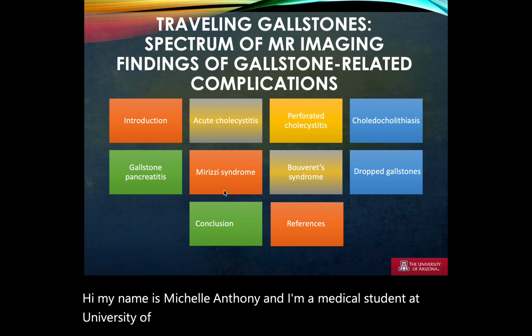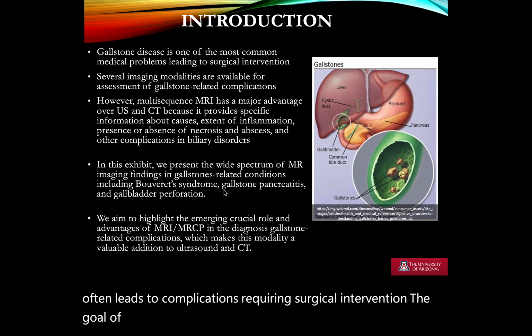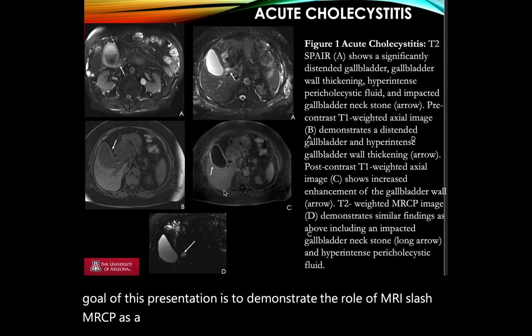Gallstones is a very common entity that often leads to complications requiring surgical intervention. The goal of this presentation is to demonstrate the role of MRI/MRCP as a valuable addition for its diagnosis.